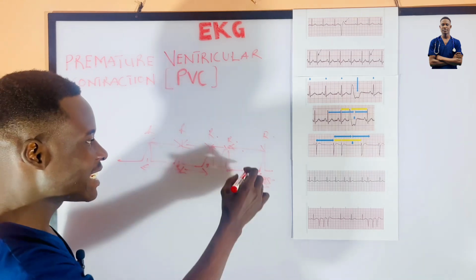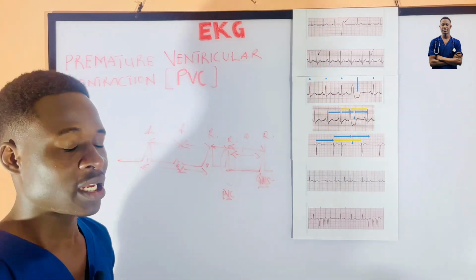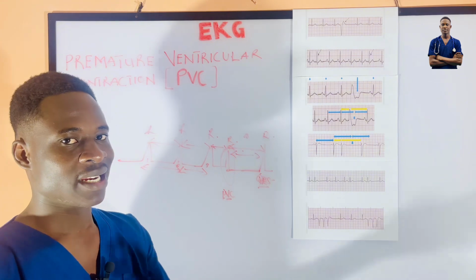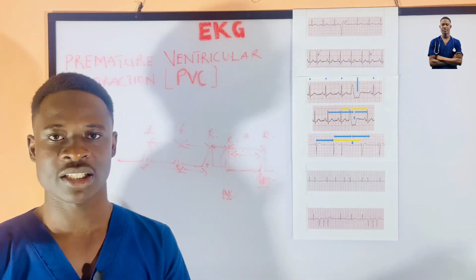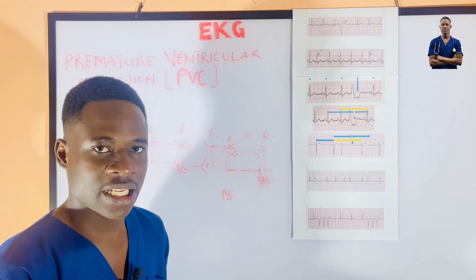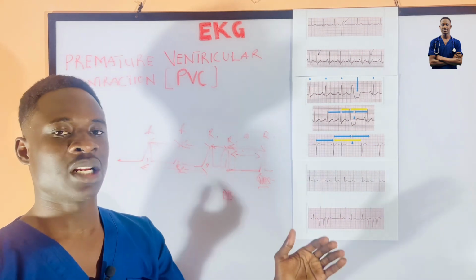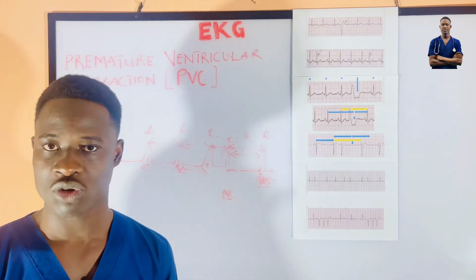And this large distance is as a result of when the ventricles generate impulses on their own and contract, the heart needs to compensate for that contraction. So the heart needs to relax and then reorganize itself and produce new sinus transmission so that it will be moved into the ventricles and then cause normal contraction.